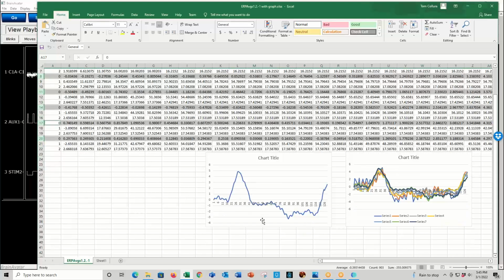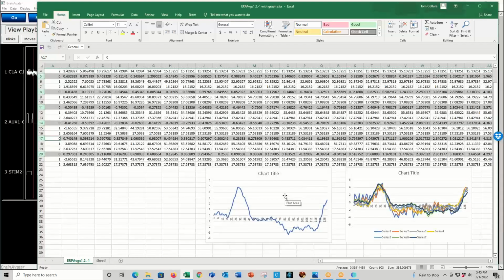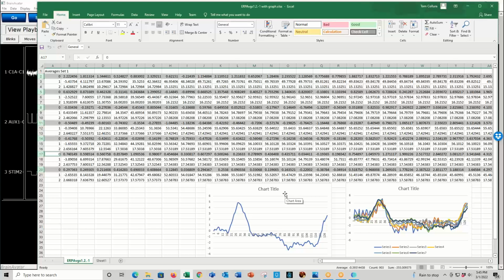This graph on the bottom shows the average of the, this was 128 evoked potentials. And then this shows the convergence as you add them up, first 8, 16, 32, 64, et cetera, and the more averages you tie in, then the more you converge to that average for the evoked potential. This would be a checkerboard visual evoked potential.